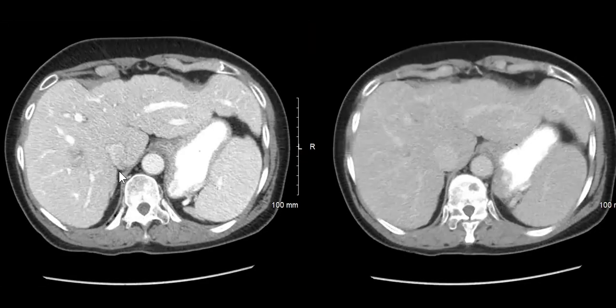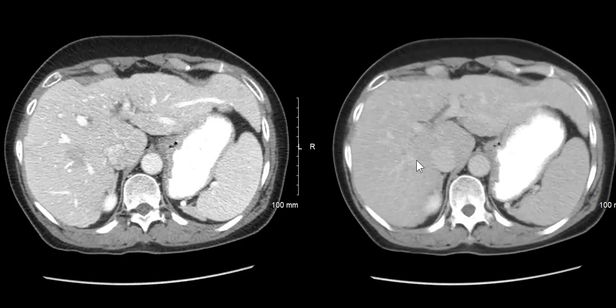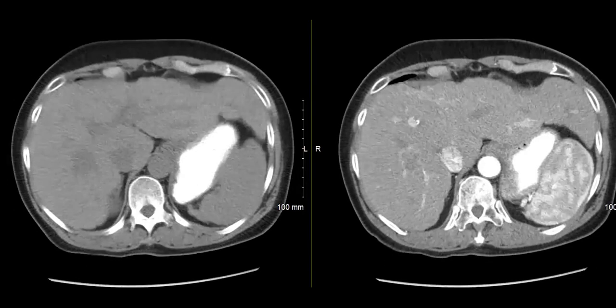Very similar to the first case I showed you. It doesn't really have kind of ill-defined, almost picks up contrast in the delays. So this is again with the LRM. Once you have any one of the targeted features, rim arterial phase hyperenhancement, peripheral washout, delayed central enhancement, all of that immediately goes into LRM category.